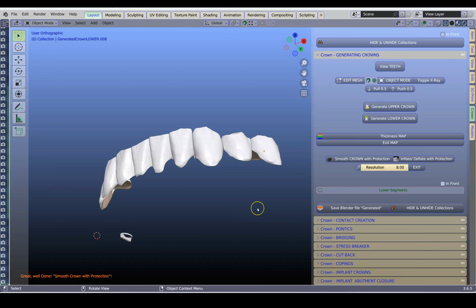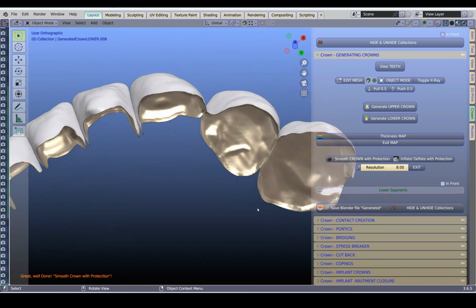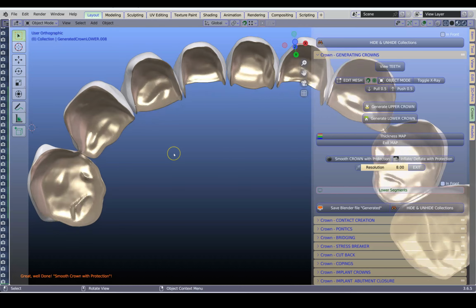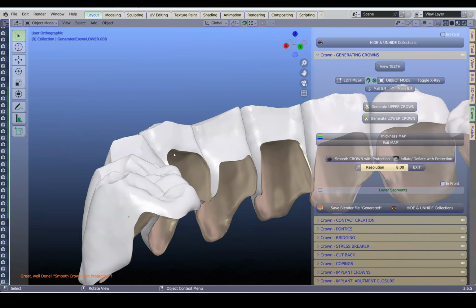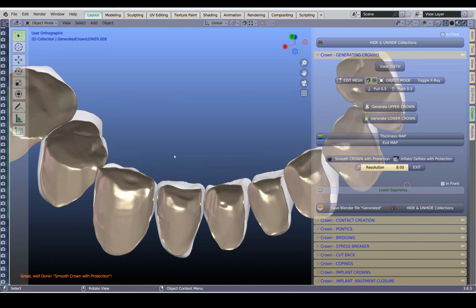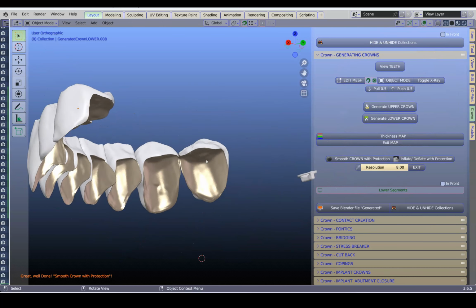Okay, this is looking really good. Finally, we want to focus on the contacts. I won't do this in this specific video, but in the forthcoming video I will demonstrate that, or please go to the website for information on how to make these contacts correct.